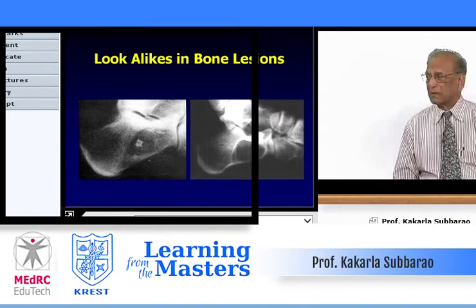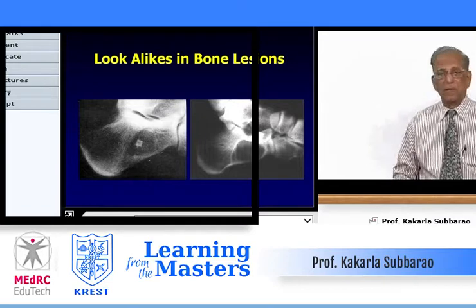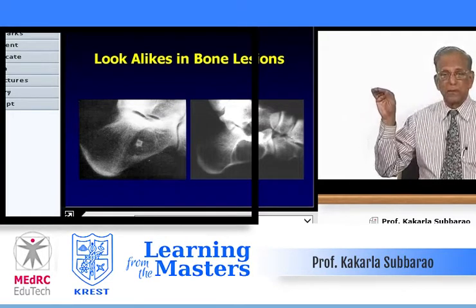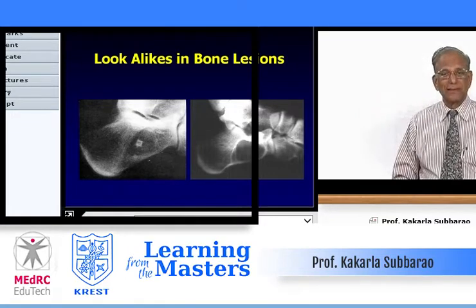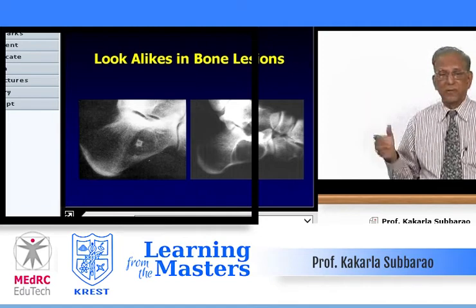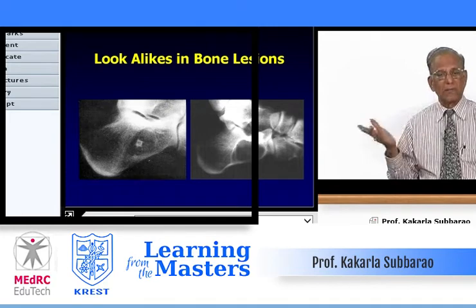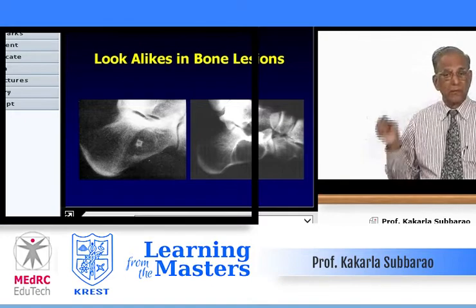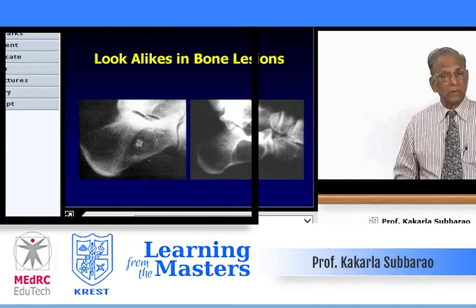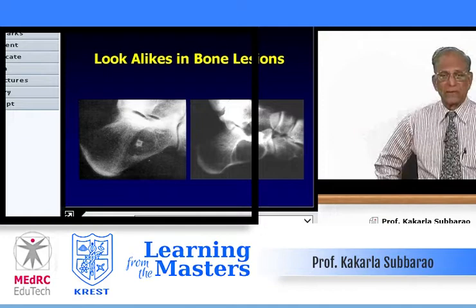Two calcaneae, we don't know the ages because the apophyses are closed. Obviously they are adults. The one superiorly noted, it has got a calcific nugget. Maybe ossification also. It's hard to tell just on plain films whether it is calcification or ossification. Majority of the calcifications may go into ossification. If you see trabeculae or cortical bone, definitely it is ossification. But in the absence of it, it's very difficult to differentiate. But anyway, let us take it for calcification.